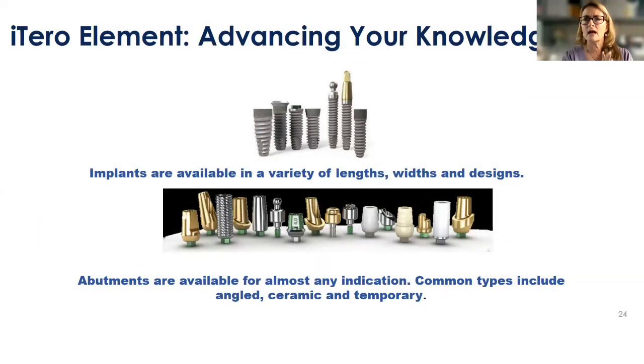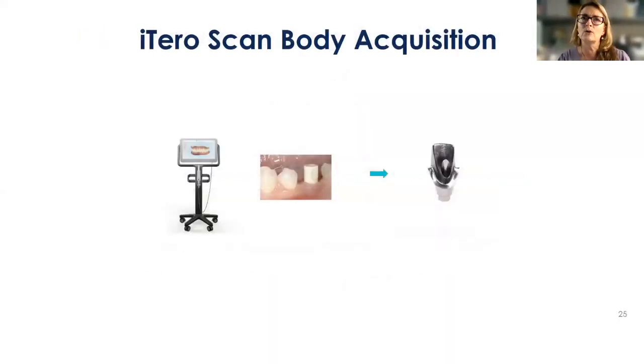So lots of availability with different types of implants and different types of scan bodies. So this is just a variety of manufacturers that are here. Today, we're going to talk specifically about scanning with iTero, a scan body to create a custom abutment and crown.